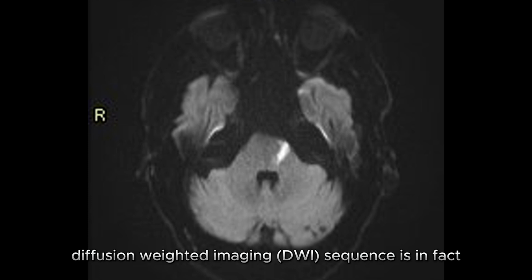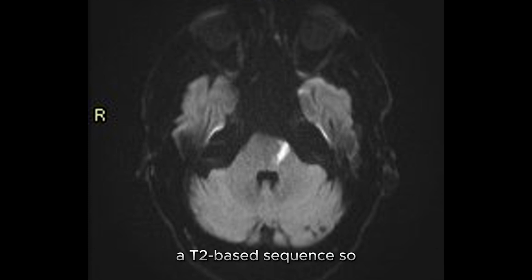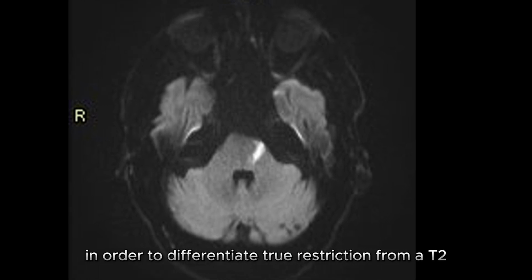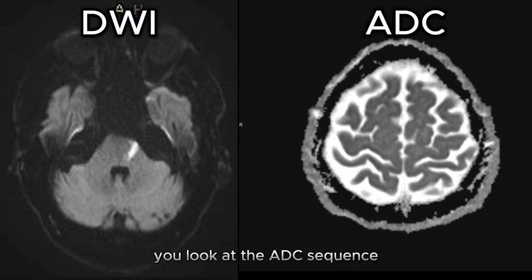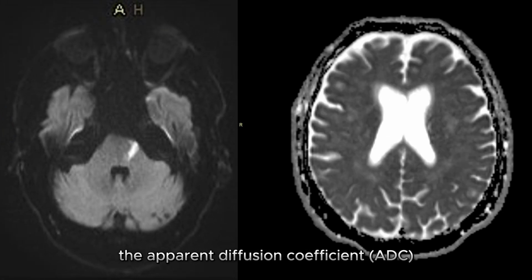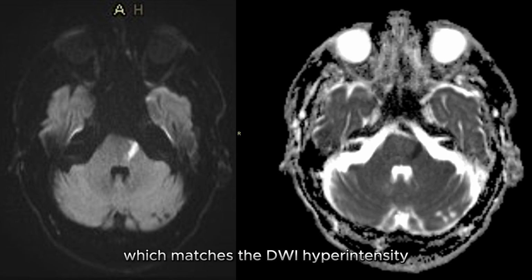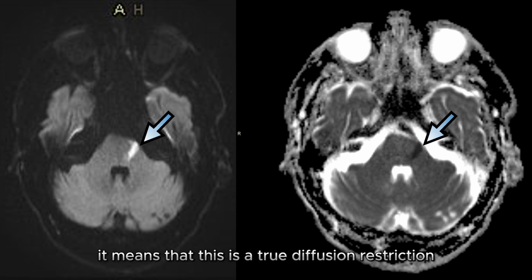Diffusion-weighted imaging sequence is in fact a T2-based sequence. So a high T2 signal can also show as a DWI hyperintensity, the so-called T2 shine-through. In order to differentiate true restriction from a T2 shine-through, you look at the ADC sequence, the apparent diffusion coefficient. If there is a hypointense area on the ADC which matches the DWI hyperintensity, such as in this case, it means that this is a true diffusion restriction.